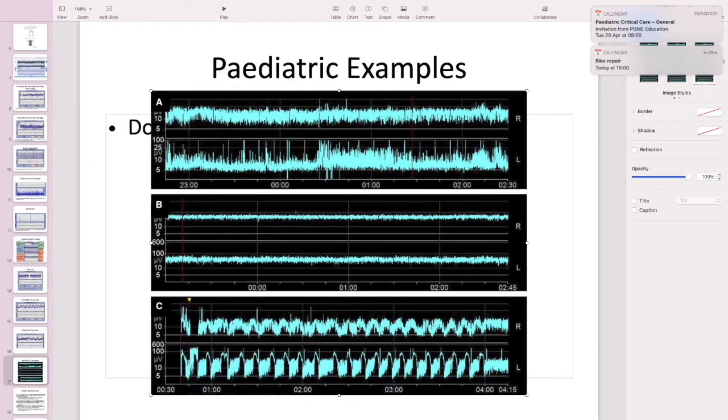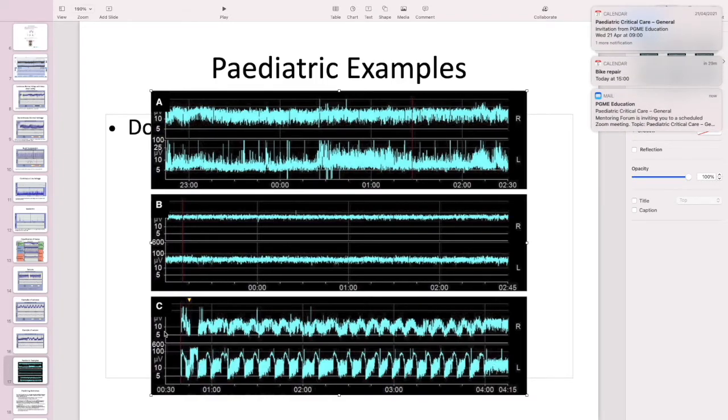On the top, you can't really distinguish it from the background activity, but on the left-hand side, you can really see these obvious spikes just continuously seizing. And you can see how this isn't much different from the early examples I showed you of neonatal seizures, that even if you didn't know how to interpret a raw EEG, you could look at this, recognize that pattern of high amplitude, and that would tell you there are seizures going on. And then if you're a bit more experienced or feel more confident, you could look at that specific time period and see that there is epileptiform activity going on.